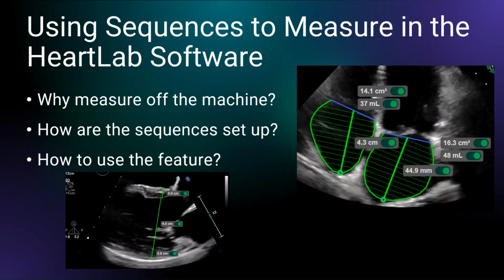Today I'm looking at using the sequences feature in the HeartLab software to actually measure a full study. I'll also be answering some initial questions: why would you consider measuring off the machine, how the sequence is set up, and how to actually use this feature.